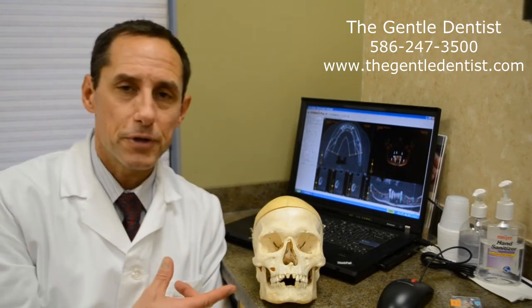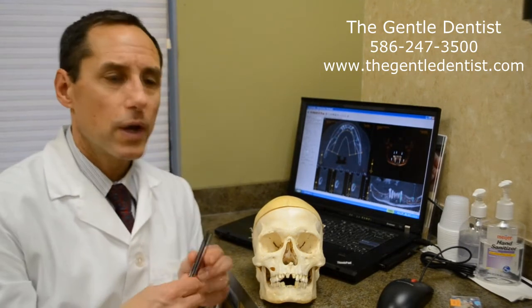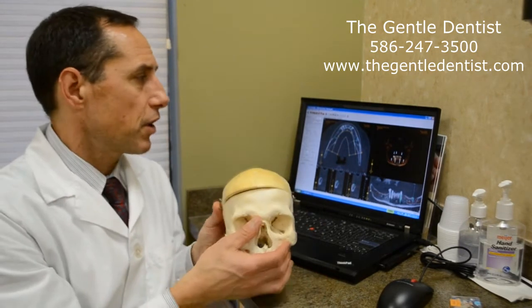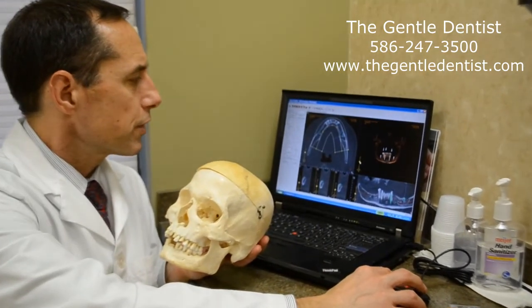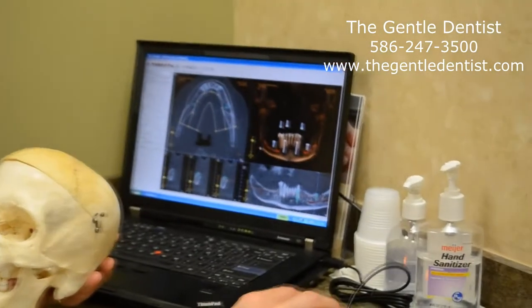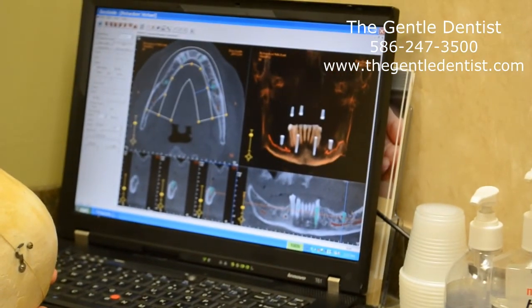And what I want to do is to demonstrate that, not on this person, but on an actual live patient that we took an x-ray of before. I had a scan done of him, and we did some virtual placement of some implants in that. And I just want to show you a comparison about what this can show versus what happens in a skull. Okay, so as we see here in this picture, we can see within this skull we have, let's see, your brightness.